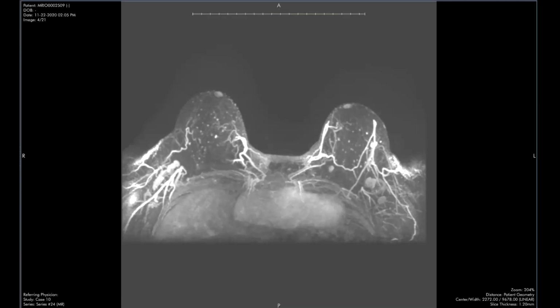But with that being said, this is the first finding that there's agreement fits criteria for a BI-RADS 3, and it is along a theme that we've talked about, and this is that oval circumscribed mass. So I'm starting off by showing a MIP MRI image, and I like looking at these MIP images early on when I'm reading MRIs because it gives a lay of the land, and you can see if anything stands out. And right away, we see this mass in our left breast. When we're looking at the MIP, we don't know if it's upper or lower, but it definitely stands out to us.